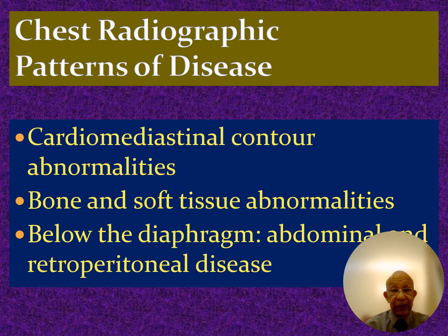You really need to assess for patterns like cardiomediastinal contour abnormalities, bone and soft tissue abnormalities, and you look below the diaphragm to assess for any abdominal pathology.